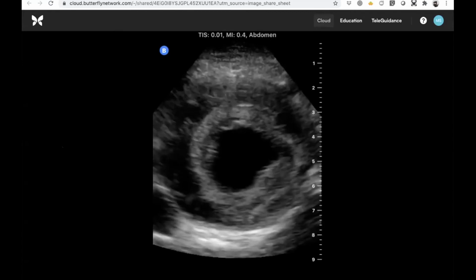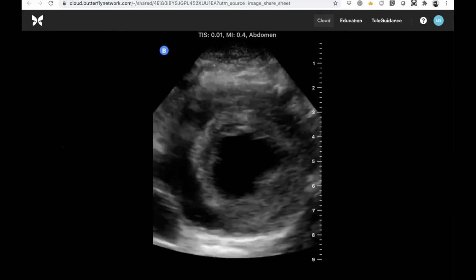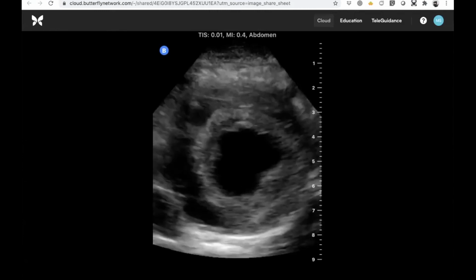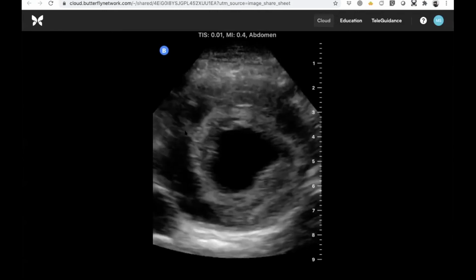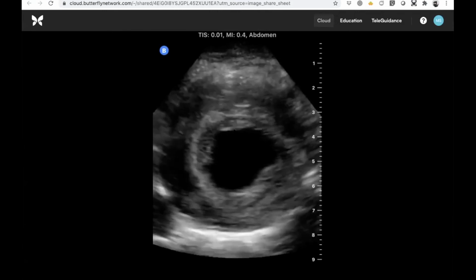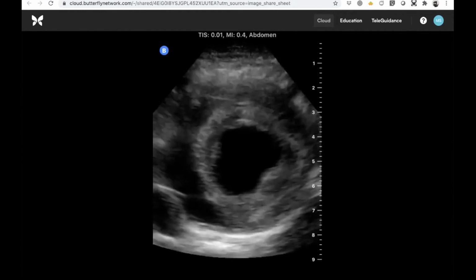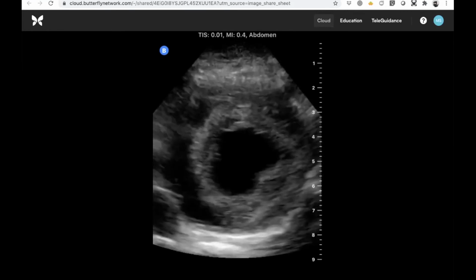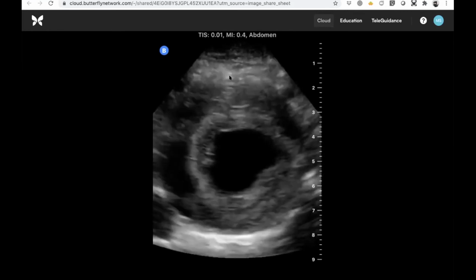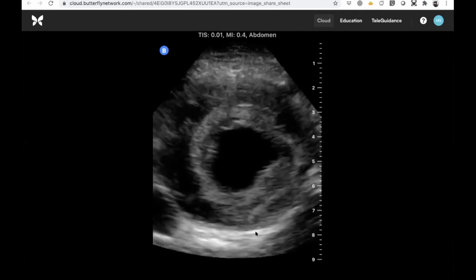Yeah, so this brings up a number of key points. One, when you measure an abdominal aortic aneurysm, there's often a lot of mural thrombus, a lot of clot in the wall, and the measurement should not go from lumen to lumen. You will underestimate the size by a lot. In this case, you'd call it a 2.5 centimeter aorta, which would be normal, and this is clearly far from normal. So you want to go from outside wall to outside wall.